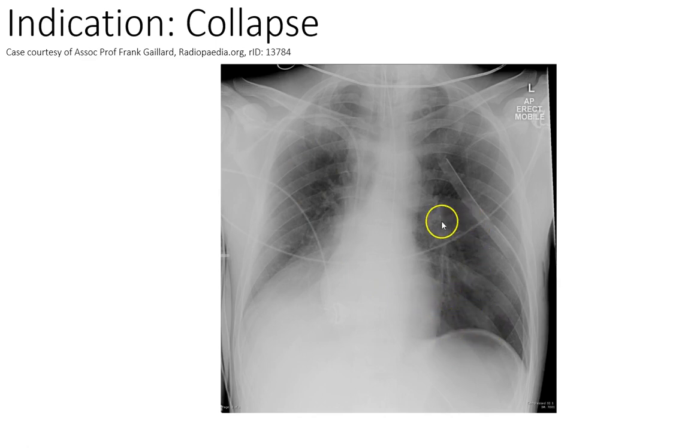So I'd be keeping an eye on what's going on with their oxygen levels, if they've got other organs in trouble, what their airway pressure is doing, and so on, because this is a person who's ventilated. But the overriding feature of this film for a physiotherapist is that you've perhaps got collapse of this side that we need to reinflate.